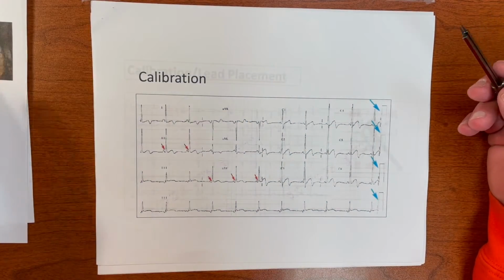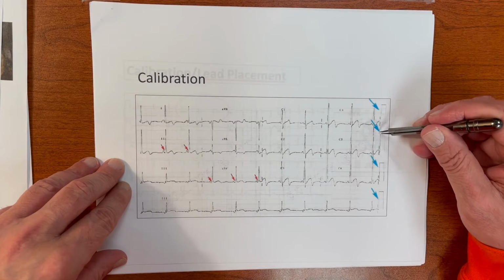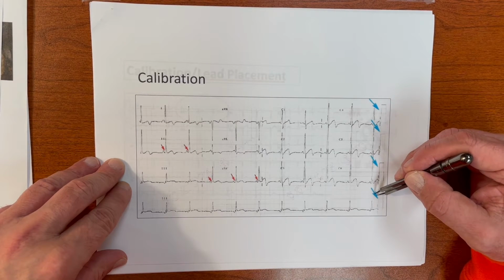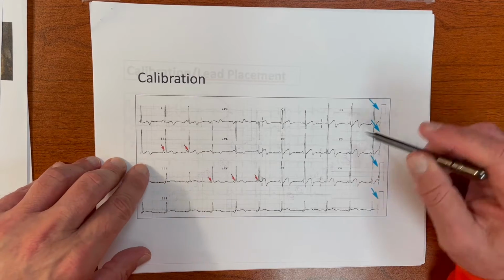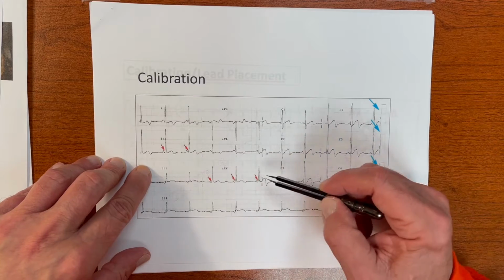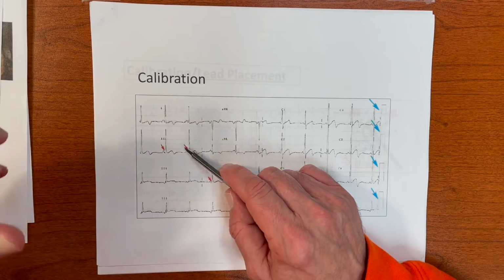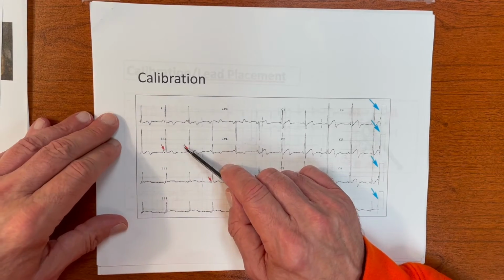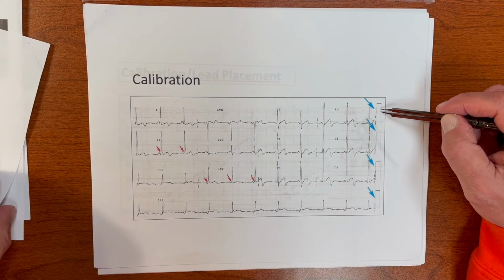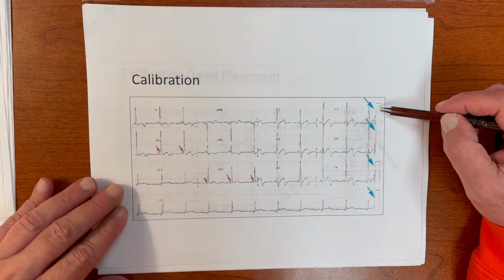For example, here in this EKG, notice that my standardization now is at least three large boxes tall. Note the arrows. We did that manually so we could see where the red arrows are pointing, which is a delta wave. So we can change this manually if we want to amplify complexes to look at something that's small on the 12 lead. The other way this gets changed is inadvertently, typically on a non-cardiac ward where somebody hits the button wrong. All right.